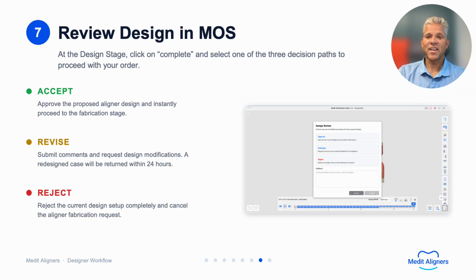After reviewing the setup, click the Complete button located in the bottom right-hand corner to approve the case. You'll also have the option to modify the setup by submitting comments back to the designer, in which case a new setup will be available within 24 hours, or reject and cancel the case completely.